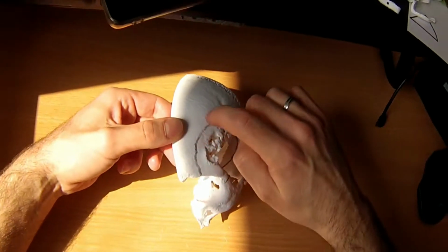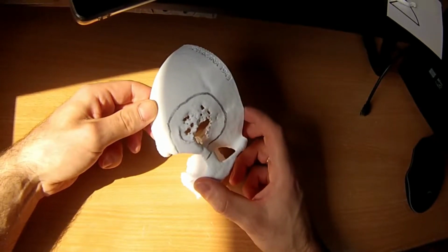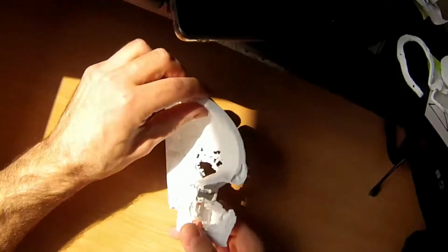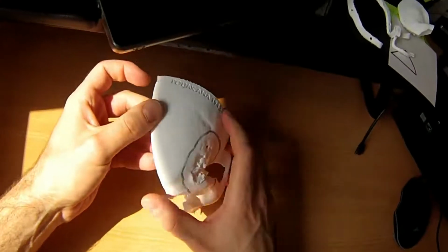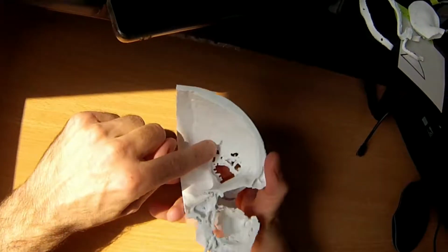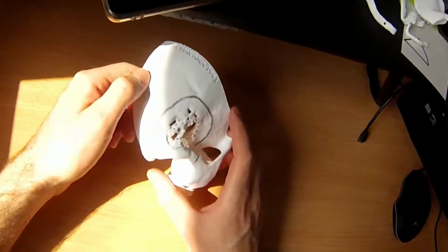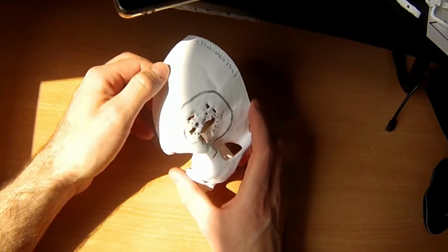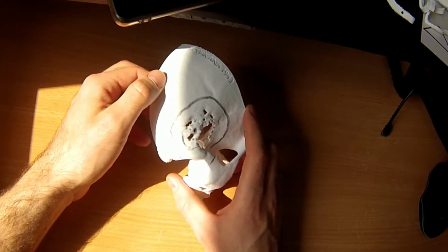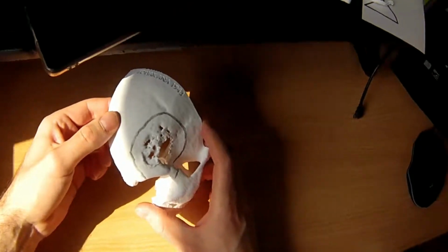The idea is to have a centimeter from the diseased bone. I have to be careful because the defect in the inner tabula is bigger than on the outer tabula. So yeah, I will try to make a cutting guide according to this plan.